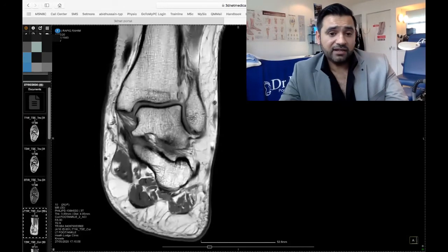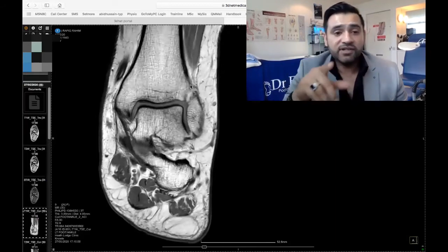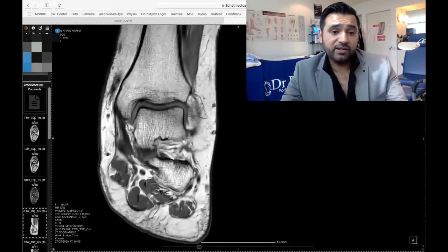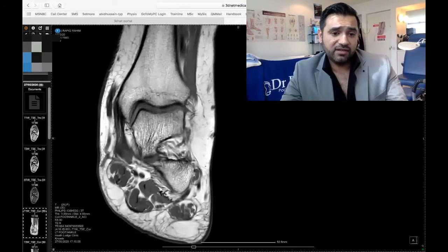And the calcaneofibular ligament is further down. It's a very thin structure. Syndesmosis I find very difficult to pick up on here. You can actually pick up the spring ligament on here as well. Further down, it is just there.